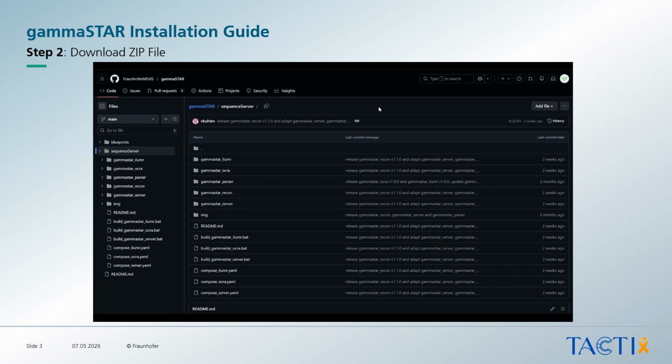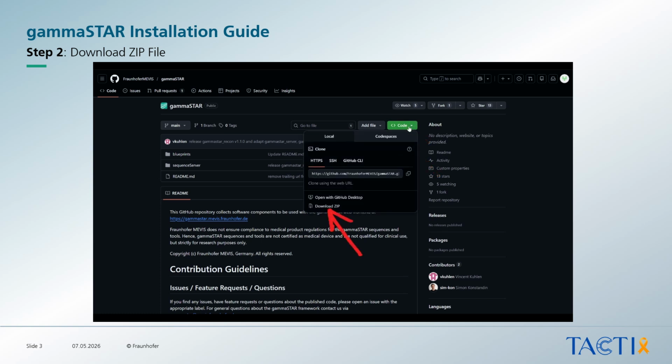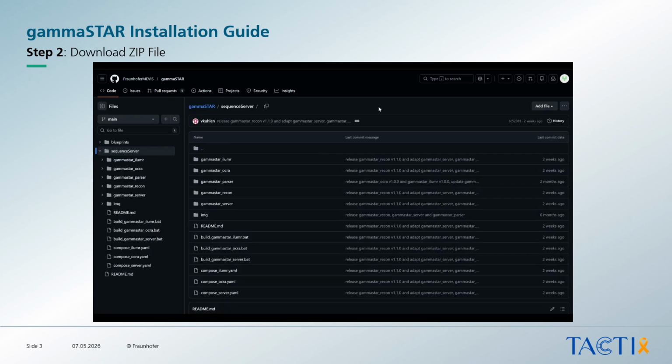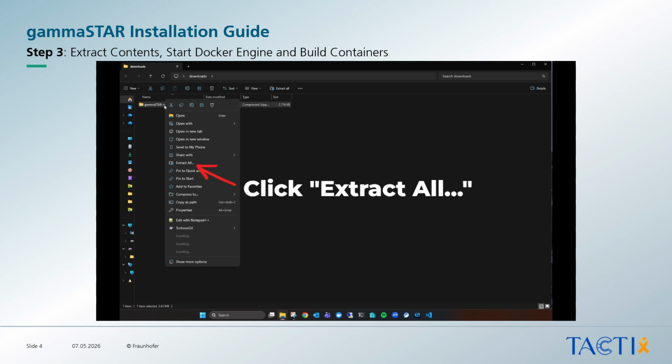Next, you need to download the zip files as demonstrated here. Finally, extract the contents of the zip file to a place of your choice.